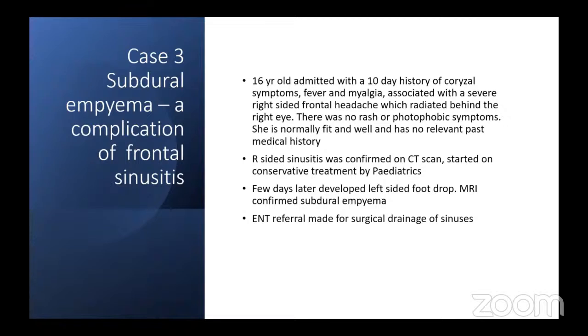Therefore, an MRI scan was carried out. The MRI did show subdural empyema. The earlier CT scan wasn't sensitive enough to identify intracranial complications, or the child developed complications later, and therefore MRI was able to pick up the subdural empyema. Either way, she needed the focus of infection to be drained, and therefore an ENT referral was made.